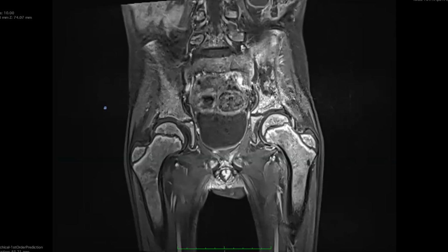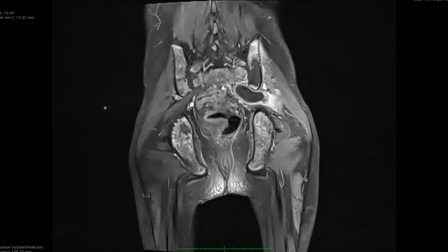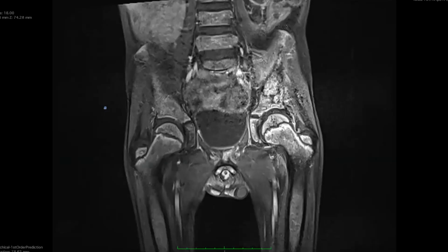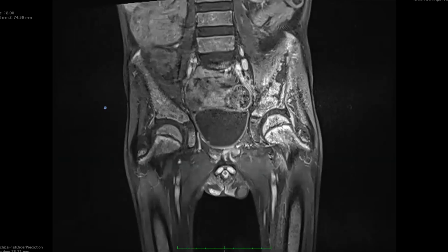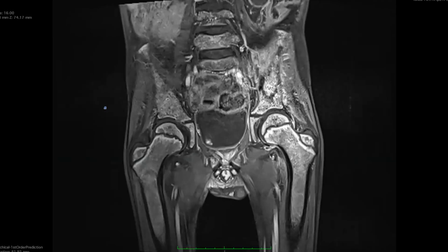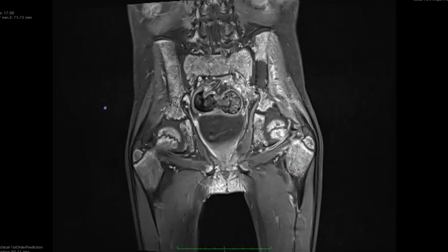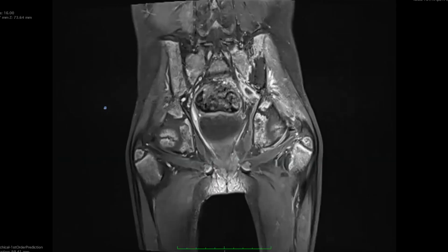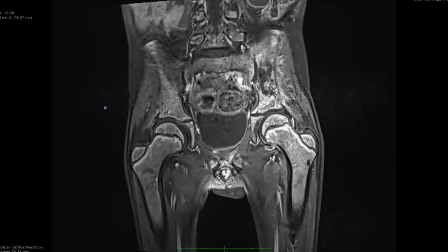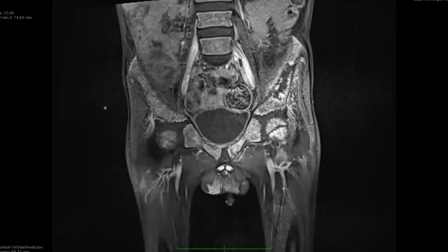There is diffuse enhancement seen in the marrow. However, the areas which showed restricted diffusion reveal non-enhancement. So I feel I'm looking at some sort of bone infarcts involving the bone, with the rest of the marrow revealing excessive marrow red blood cell production. So a myeloproliferative kind of condition. One of my differential diagnoses would also include sickle cell disease.